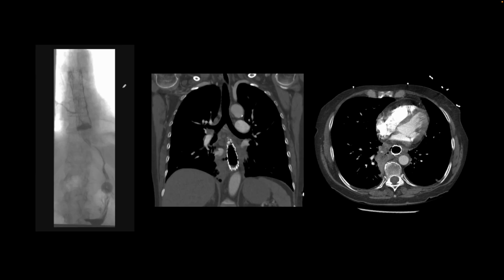Here's our next patient. We'll start with the barium study. We find that they have a stent in the esophagus. They've swallowed the barium. Some of it has gone into the stomach. It could be water-soluble contrast as well. We see that there is a percutaneous gastrostomy catheter in place, and we find that some of it is extravasating from the right side into the right hemithorax and the right pleural space.